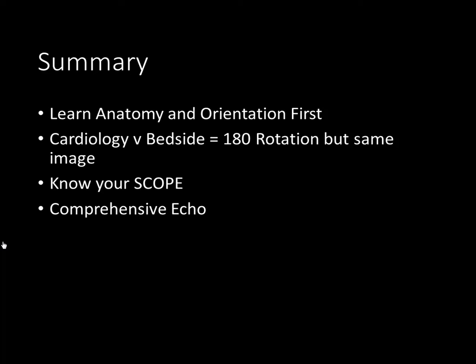In summary, cardiac exams can help assess a patient's hemodynamic status and guide our management and treatment. However, it's important to begin with the first steps and have a good foundation knowing the anatomy and orientation. As discussed multiple times in this lecture, cardiology and bedside ultrasounds have similar anatomic alignment, however the views are rotated 180 degrees on both the screen and the probe. Thus, the images will look the same.